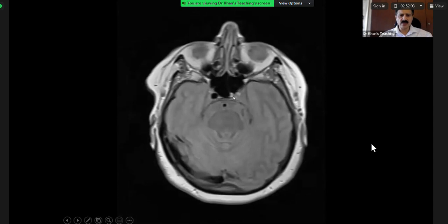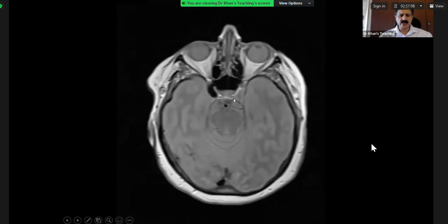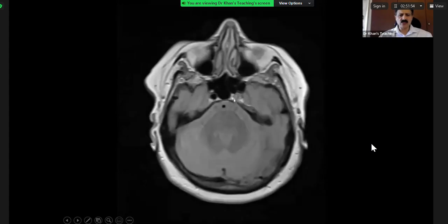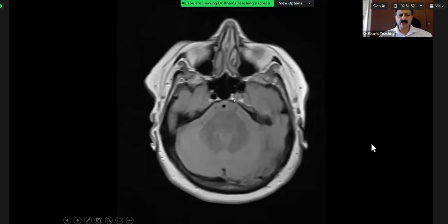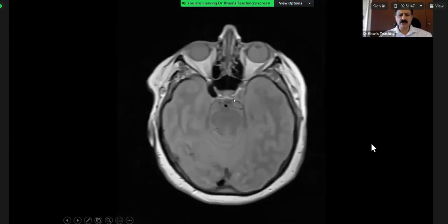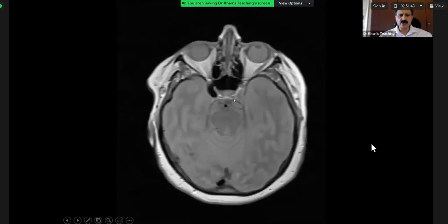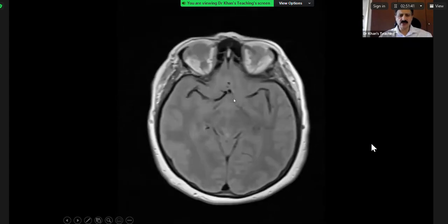And the same thing here in the cavernous portion, and on the right side, it is visible. So please remember that, these kinds of cases have come in the exam so often. The examiner will open a sequence and you are going up and down and your mind is just working on the parenchyma, and actually the abnormality is sitting here.